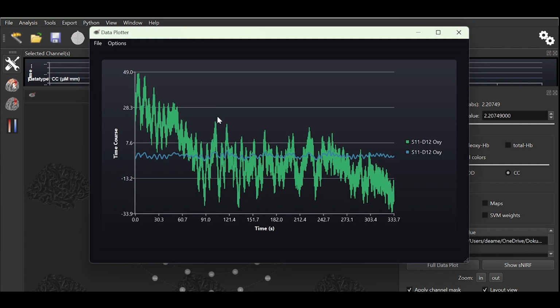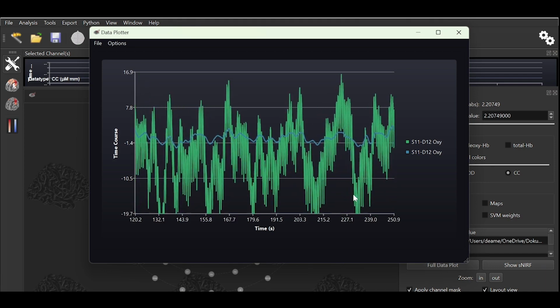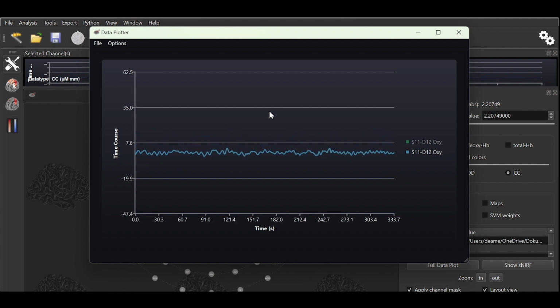By left-clicking and dragging the plot, we can zoom in on the two time series and check out the differences. We can also turn off the view of any channel by name in the legend. And a double right-click will reset the zoom to the standard setting.